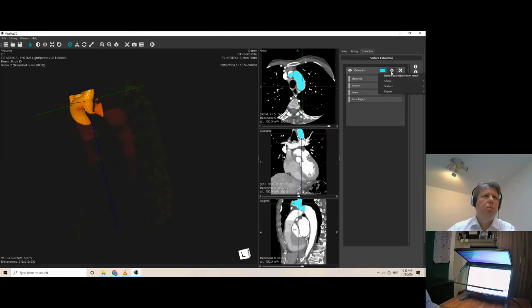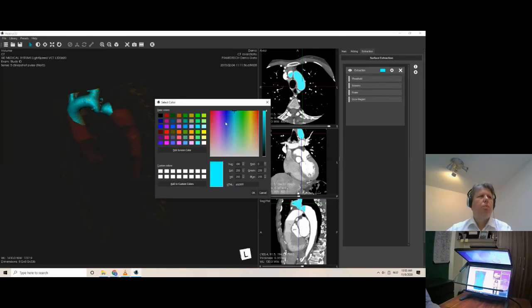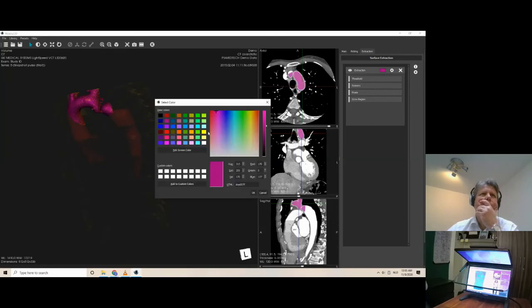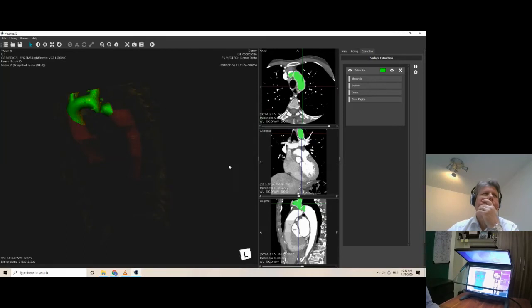The last element is you go into the surface, smooth the surface. And that's also a step where you can change the color. And I'll go into why you do that, of your extraction. So here is where you can change it. You can make it, for example, red or green or whatever. In this case, I take a beautiful green element because it makes it clearer in what I want to show you.